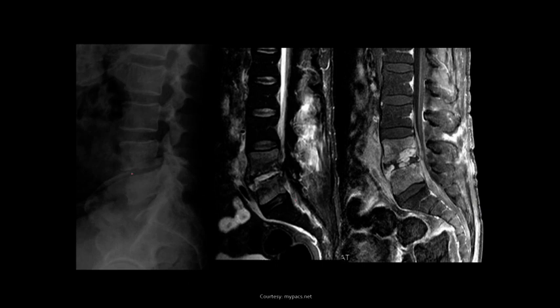Here's another one. So we have loss of the anterosuperior end plate corner, as well as some destruction of the end plates, the superior and inferior end plate, loss of disc height. So this is a classic example of a spondylodiscitis. And we can see in the STIR image here and the T1 post-contrast, T1 fat suppressed, not fat suppressed, never mind. T1 just post-contrast, because we still have some of that bright tissues, where we can have that inflammatory change on the STIR.